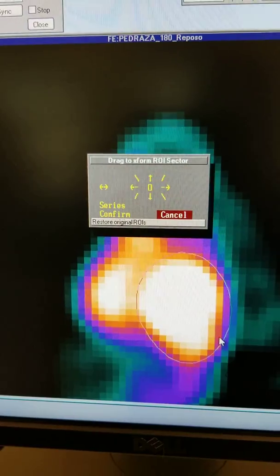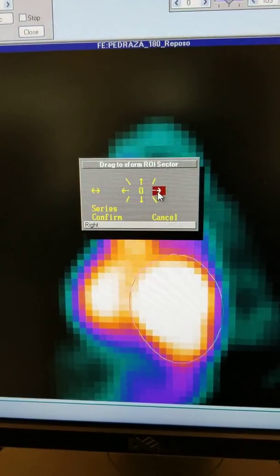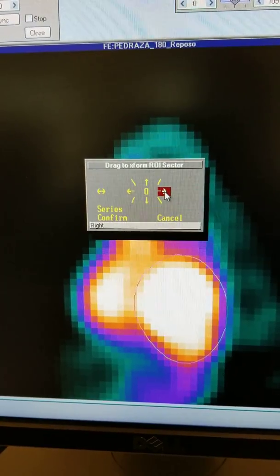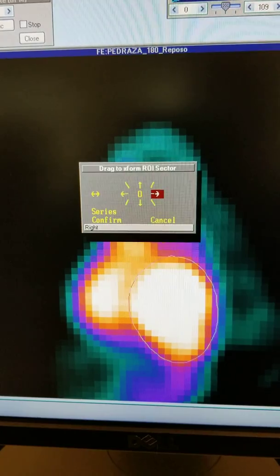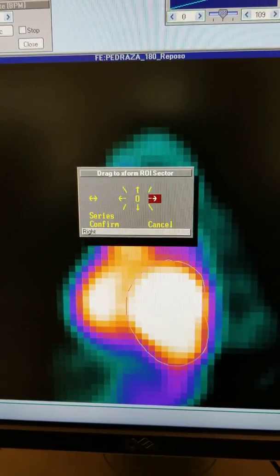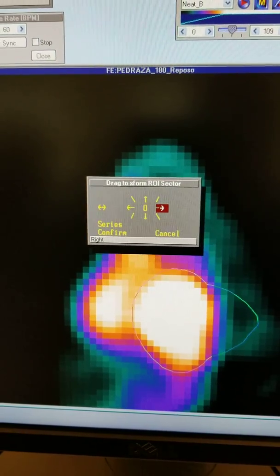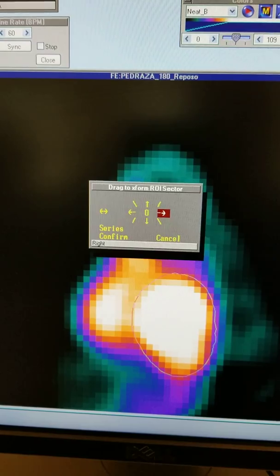That's a little lighter. We could probably suck this in over here. So I'm going to try, let's try our side view. So you're going to highlight it, click and hold down on it to make it actually adjust. See how I'm doing that? You're going to drag your mouse to the left or right. Okay, however far I want, however in I want, whatever, make it pretty.